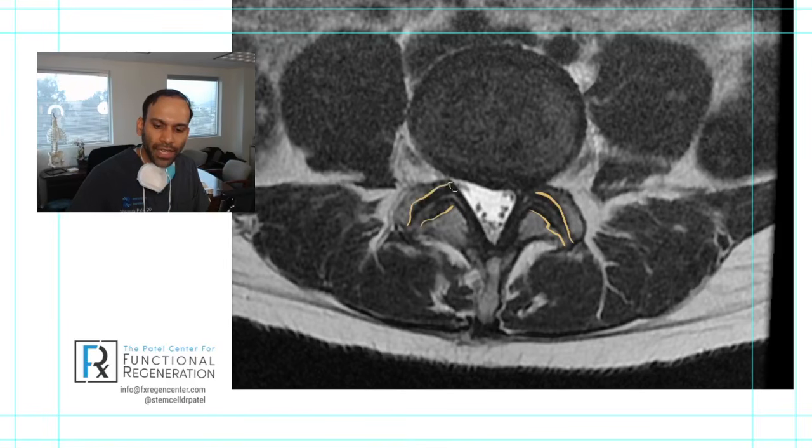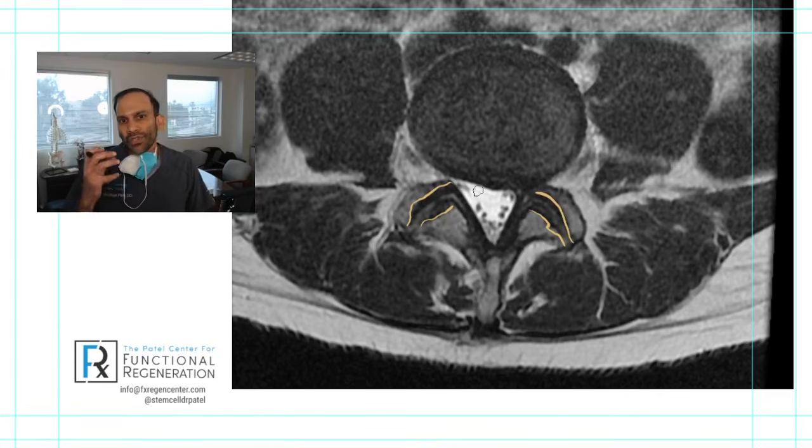So there's some tiny bit of arthritis that's starting to occur more with these hamburgers. These hamburgers aren't quite squished yet, but the hamburgers are starting to get a little bit more friction. The facet joints are starting to get a little bit more friction, and you're starting to get a little bit of roughness occurring in the bones there, okay?